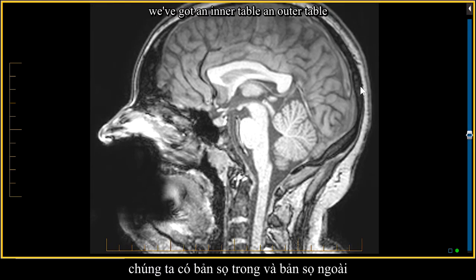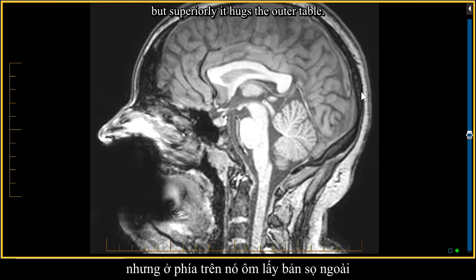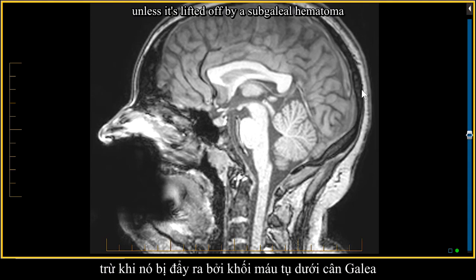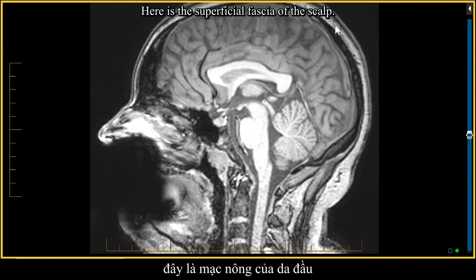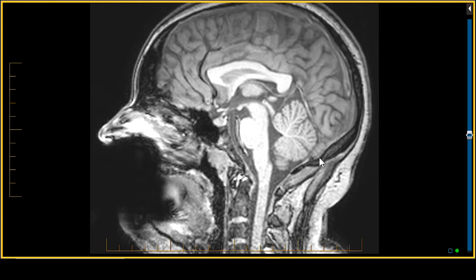You've got an inner table, an outer table, and then the galea, which is visible inferiorly, but superiorly it hugs the outer table, so it's hard to separate out the galea unless it's lifted off by a subgaleal hematoma. Here is the superficial fascia of the scalp. There's the skin, and here's some subcutaneous fat.